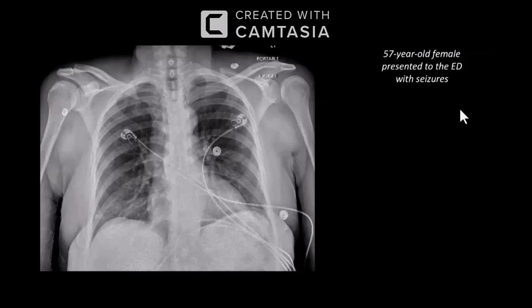Now, what catches my eye, since the patient has presented with seizures, is that the left humeral head is not well aligned with the glenoid cavity. I suspect that most likely this appears to be a posterior dislocation of the left humeral head, and it is not maintaining a parallel alignment with the glenoid cavity, and this is also in keeping with the light bulb sign on the left side.